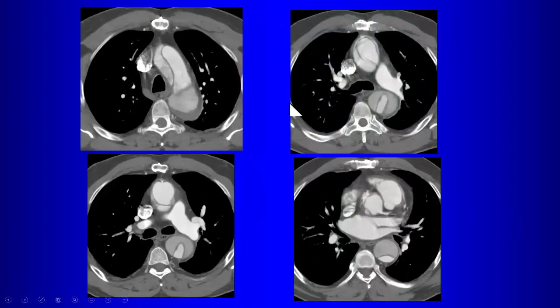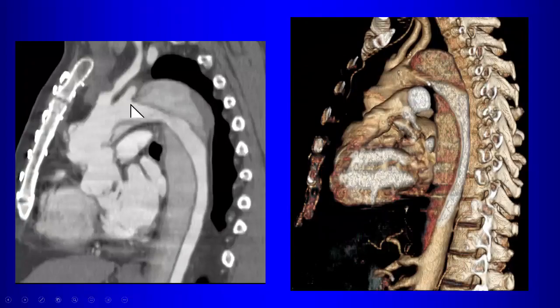And then post-contrast, you'll see that they will repair the ascending aorta, but the rest of the dissection will still be there, okay? So you'll be able to see the dissection flap going through the arch and down the descending aorta, and your job is to determine, hopefully you have the prior study, has it gotten worse, has it remained stable, etc. But the remainder of the dissection will still be there on the follow-up CT scans. So on follow-up imaging, here's the repair, this part here. It's not unusual to have a little bit of kinking where the graft is placed in the ascending aorta, and then the rest of the dissection will still be there.